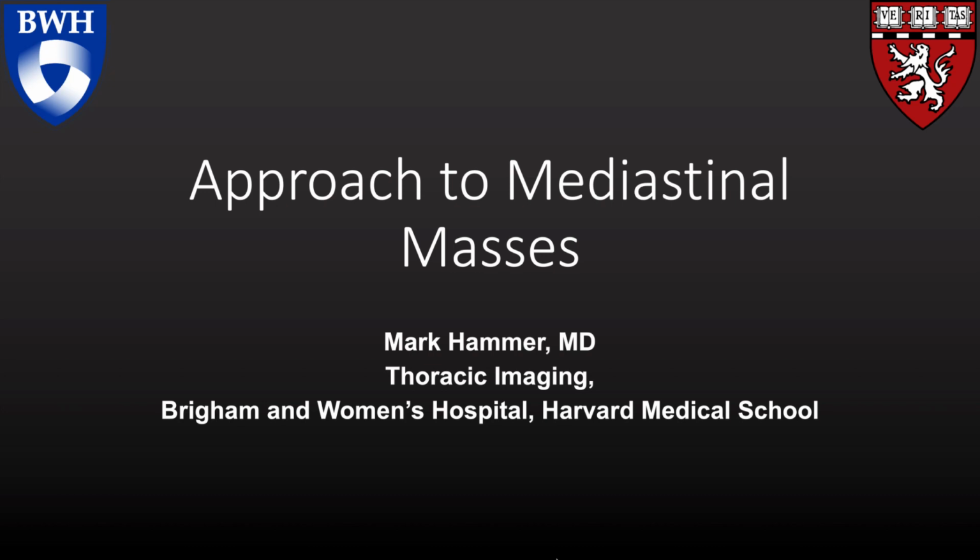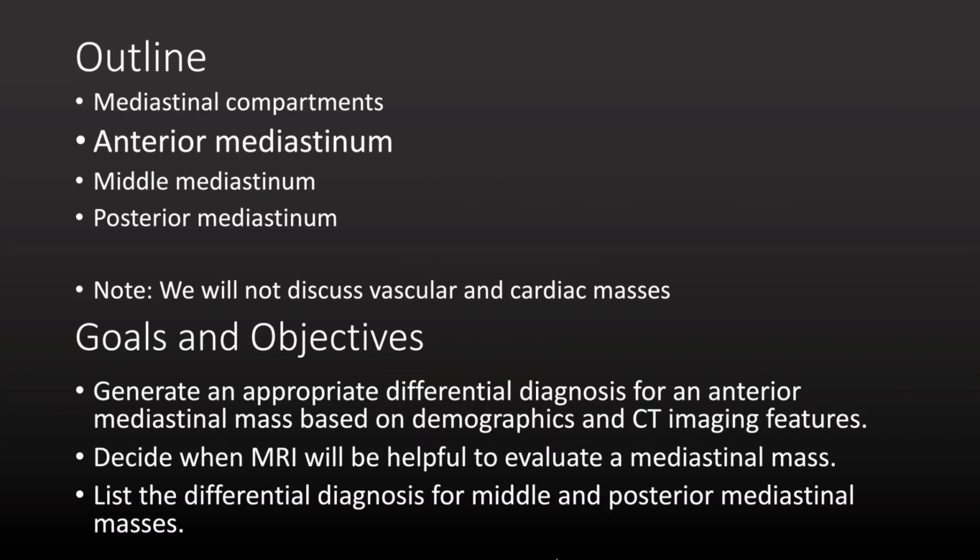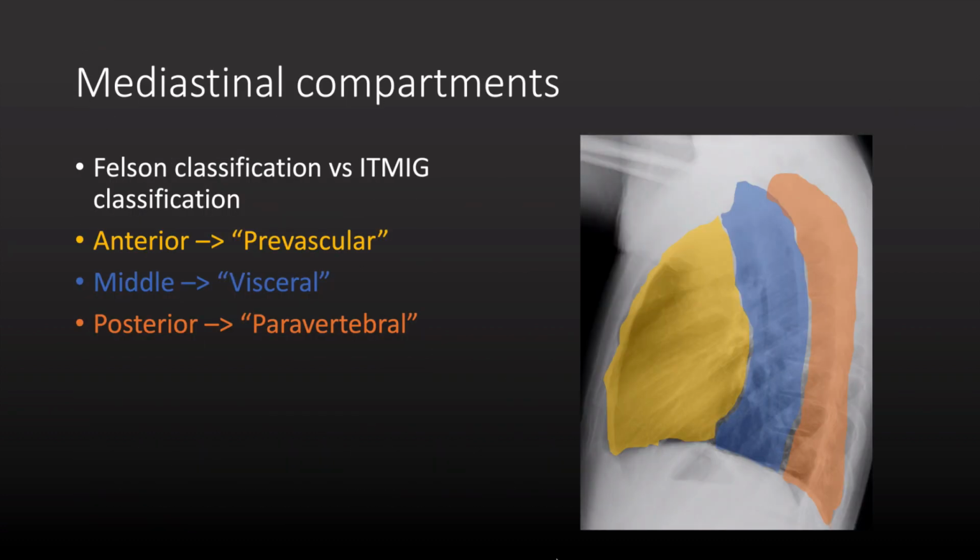I'm going to present my approach to investigating mediastinal masses. So let's just jump right in here. Now, in the mediastinum, the first thing you want to do is figure out which compartment the mass is located in, or at least centered in. So we have three compartments.